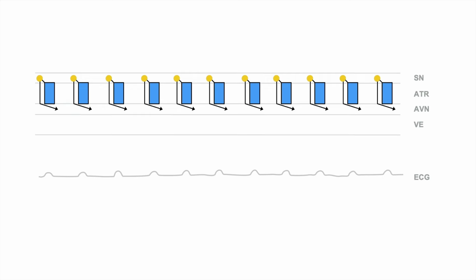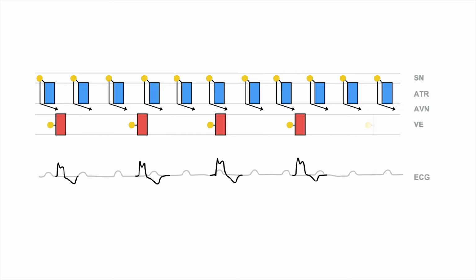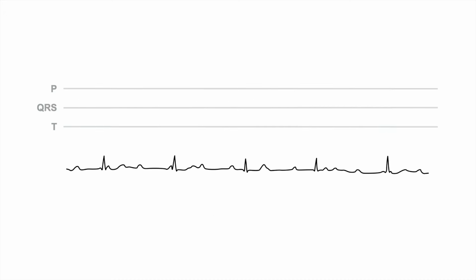Let's see what happens in the ladder diagram. The ventricular focus takes over and produces ventricular beats at a rate of around 40 to 45 per minute. This is also called a third-degree AV block with a ventricular escape rhythm. Now let's get our hands dirty and see how we can reach a diagnosis in a different real-world example. The first thing that we see when we look at this example is that there is an excess of P waves. There are a lot more P waves than QRS complexes, and the QRS complexes themselves are fairly regular with an approximate heart rate of 40 to 45 per minute.